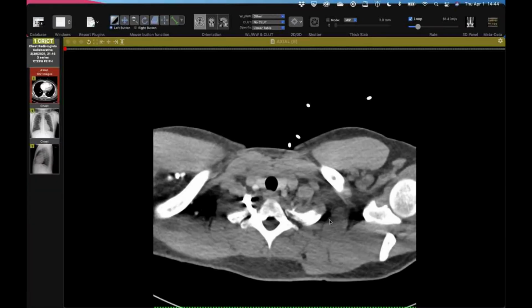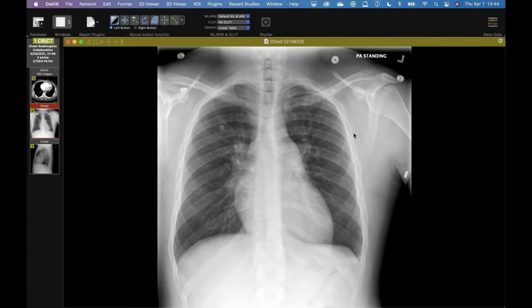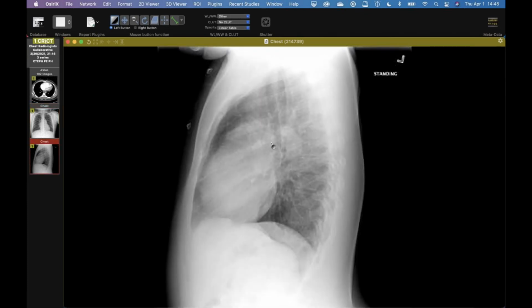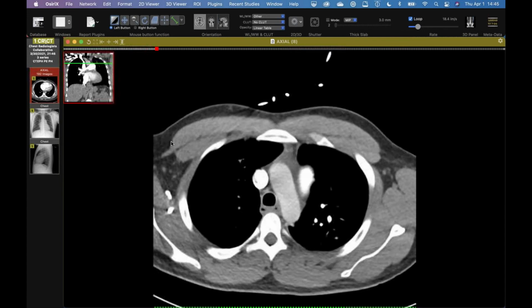So I'm glad David showed his case, because this is my companion case. This is a young guy, about 25, who was treated for so-called asthma over the past month, but you can see his radiograph is abnormal. He's got enlarged pulmonary arteries, a big main pulmonary segment. The right atrium looks big. On the lateral, you can see the nicely enlarged pulmonary arteries, and a little bit of filling in here; the main pulmonary segment is big as well. So he presented more acutely with respiratory distress and hypotension, and you'll see why in a second.